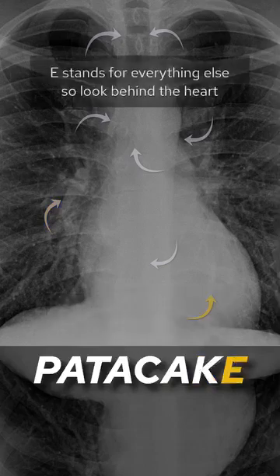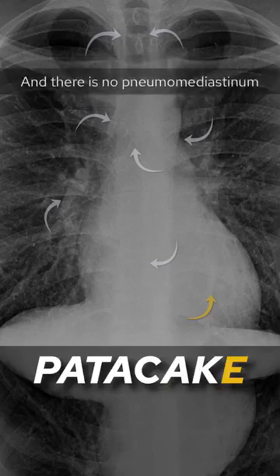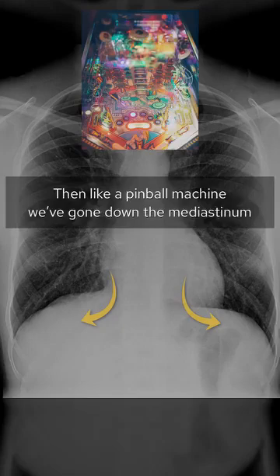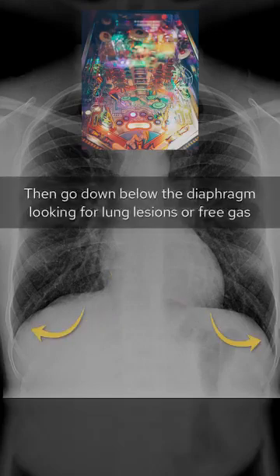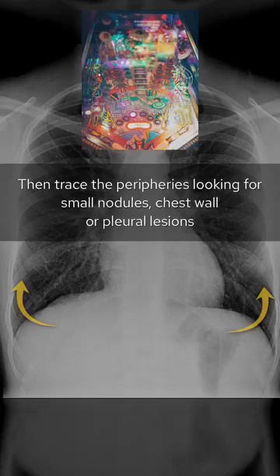Then E stands for everything else, so look behind the heart and check the cardiac contour is well defined and there's no pneumomediastinum. Then, like a pinball machine, we've gone down the mediastinum, then go down below the diaphragm looking for lung lesions or free gas, and trace the peripheries looking for small nodules, chest wall or pleural lesions.